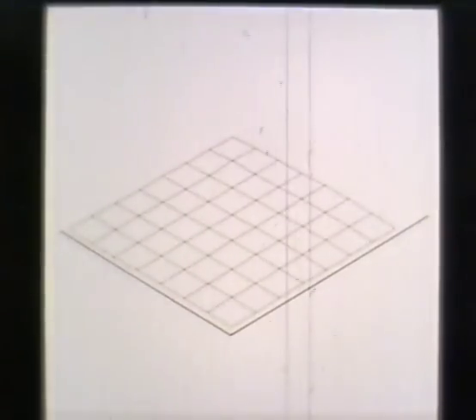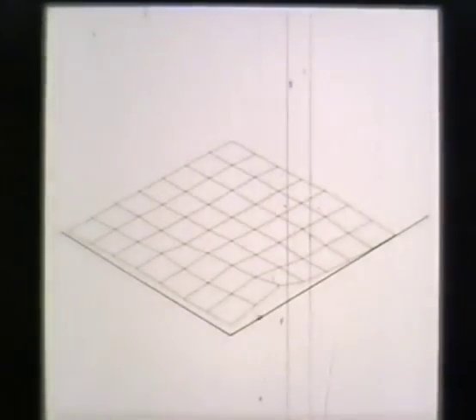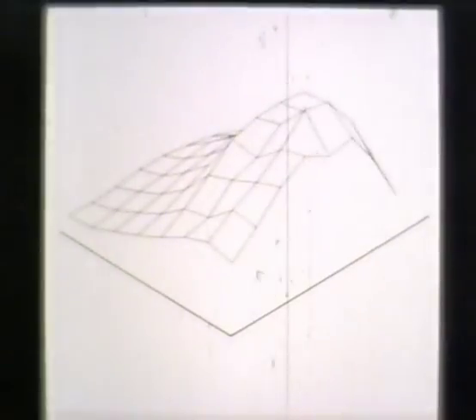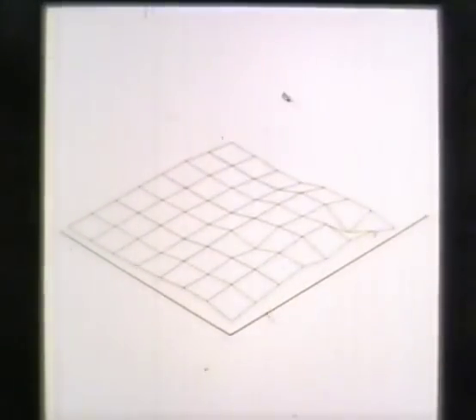The baseline segment is followed by the shock artifact, and then by the presynaptic action potential and the peak of the evoked potential. The oscillation appears to be restricted to the region of initial activation of the bulb and does not spread outwardly. It decays in the form of a damped sine wave, which has the same frequency in all regions of the active focus. Here the activity has been slowed by a factor of 800 times. In subsequent sequences, the activity is slowed by a factor of 200 times.